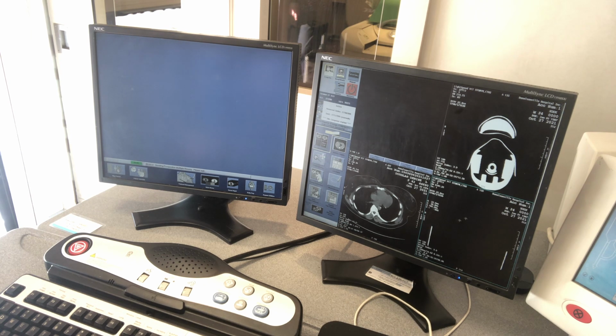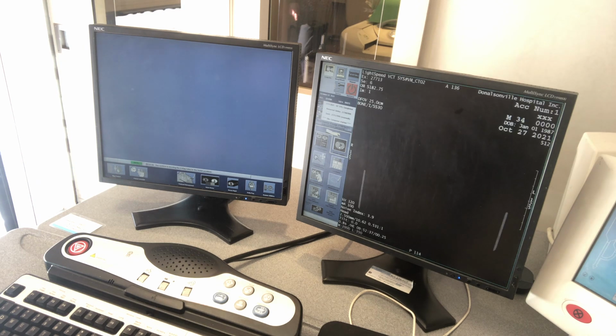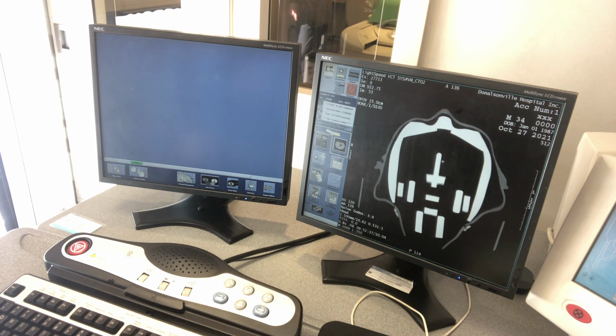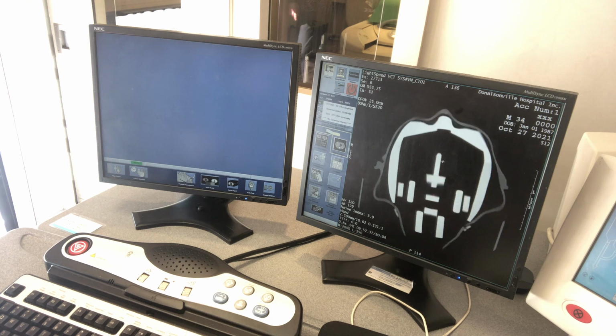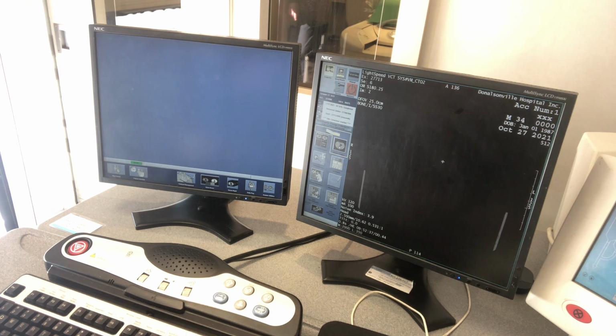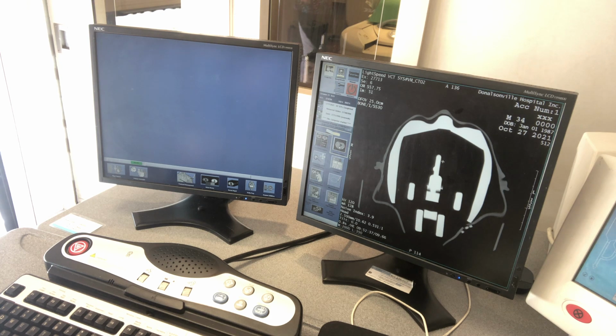Now, you have 4 boxes over here, so you can flip this toggle switch here and see it actually in one view. To scroll through your images, you can do page up and page down, and you can scroll through. It's still processing, so give it a few minutes.